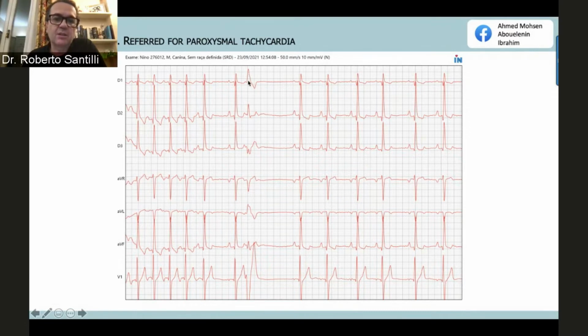As you can see here, this is positive in lead 2, but then it's negative in lead V1. Obviously, we also need the rest of the precordial leads, but sometimes the presence of a post-extrasystolic pause can suggest a ventricular ectopic beat with retrograde VA conduction and reset of the sinus node.